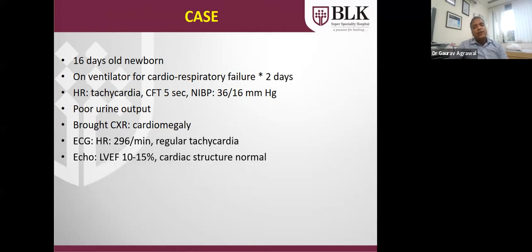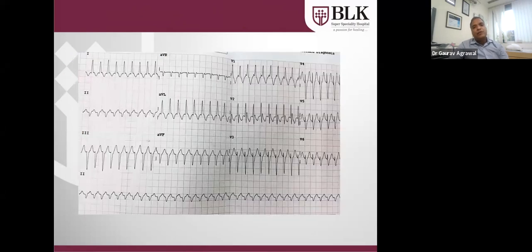X-ray shows cardiomegaly. Heart rate was 296 beats per minute. Regular tachycardia with poor LV function.